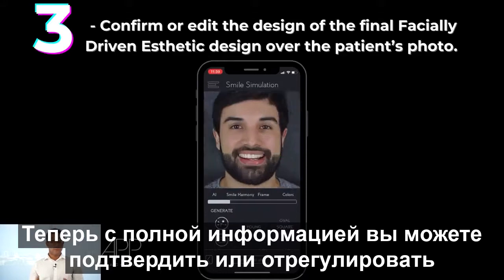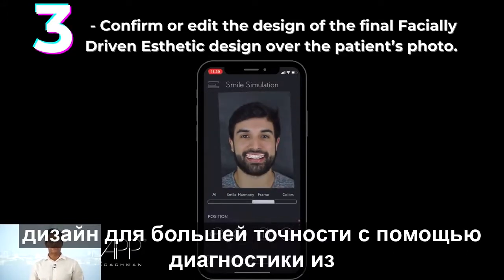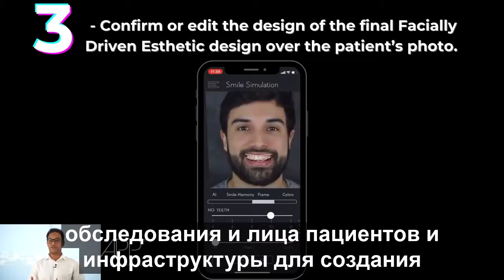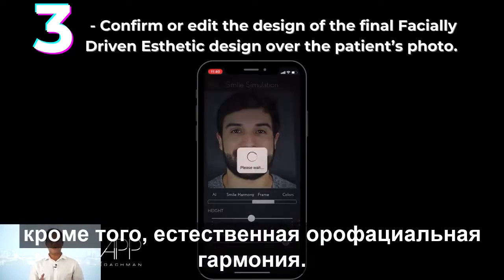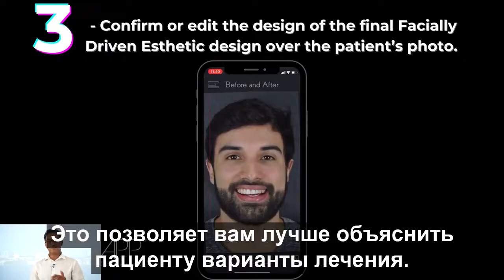Now, with the complete information, you can confirm or adjust the design for better accuracy using your diagnostics from the examinations and the patient's facial and dental structures to create natural oral-facial harmony. Moreover, it allows you to better explain the treatment options to your patient.